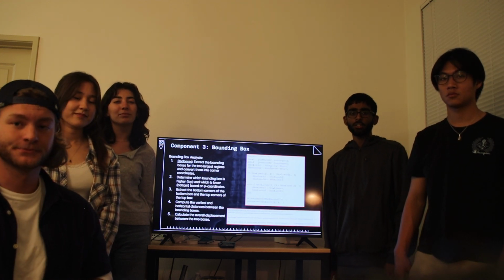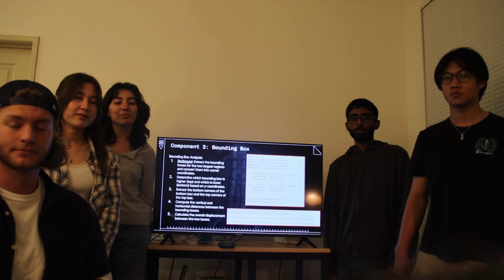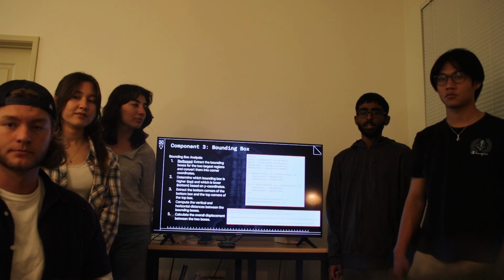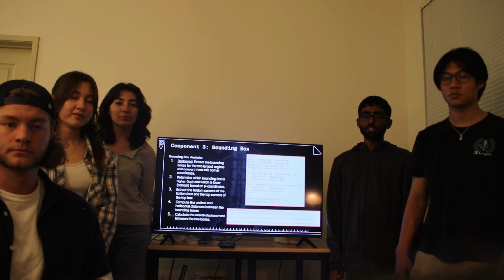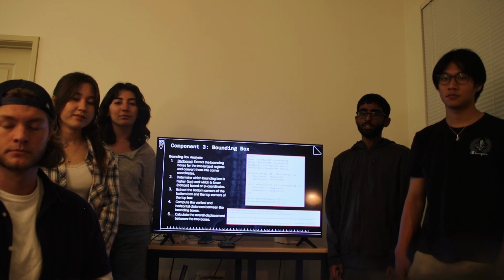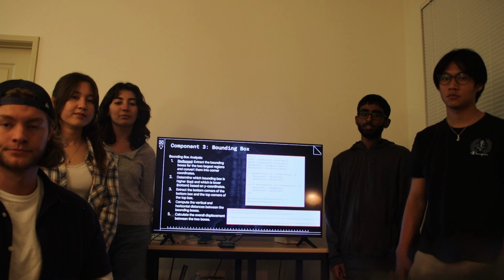Alright, so as stated earlier, bounding boxes show whether there is one bone or two bones caused by a fracture in the first bone. So we extracted the bounding boxes as shown earlier, and then we determined which of the bounding boxes representing each part of the bone is higher and which part is lower.